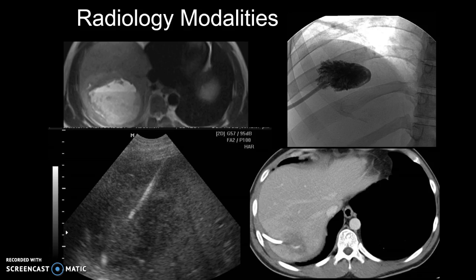This is practice looking at the different types of modalities. Do an honest guess here. Starting clockwise, we have the fluoro, CT, ultrasound, and MRI.